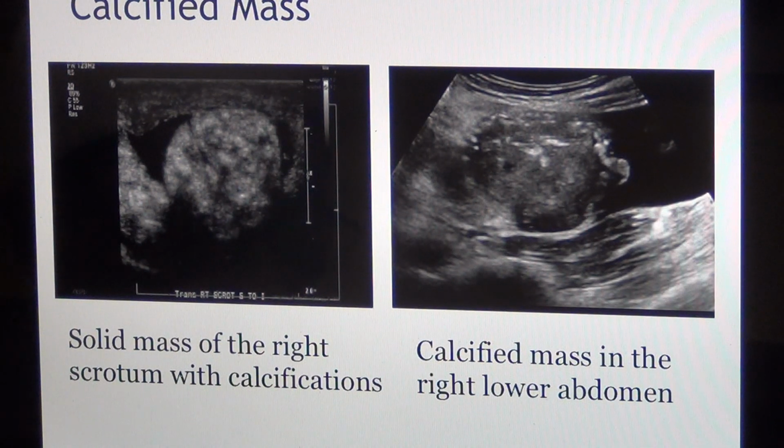There is no problem. But calcification is also a precancerous. It is a worrisome condition. So we need to understand that if there is calcification, it has to be followed up closely, because it may turn into any form anytime.